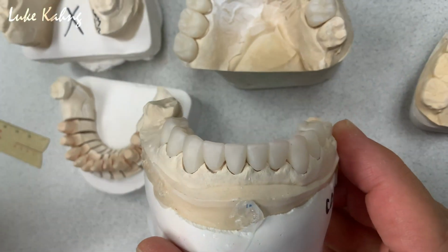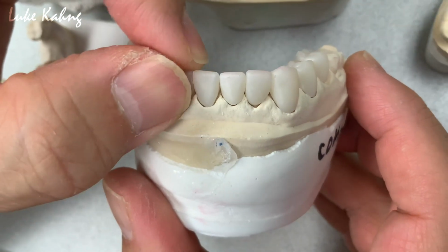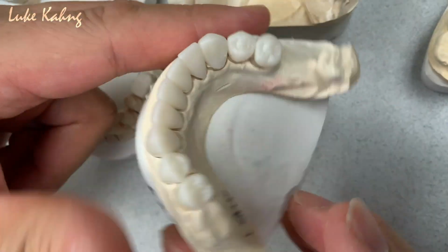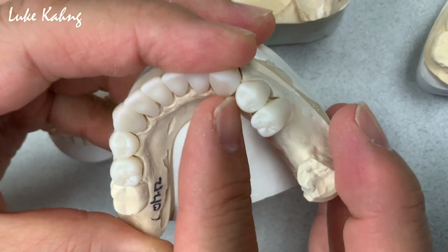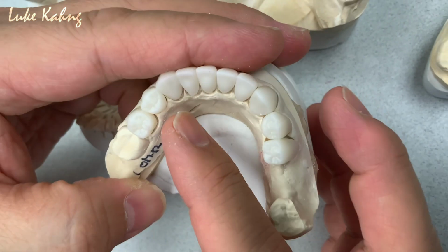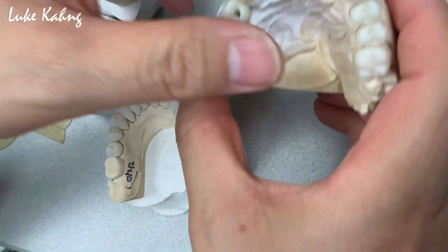So always set up the lower first, okay, with a solid cast model. This is all monolithic, right? And then here's his occlusion. So as you can see the design, I always like it like this. Okay, first premolar, and the tongue will not bother here, which is not fat. This is great too. Okay, now members, we designed the upper.